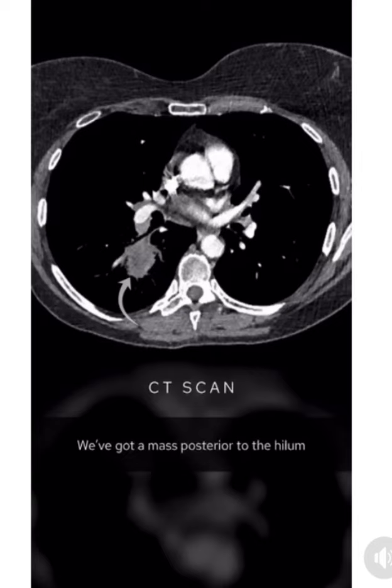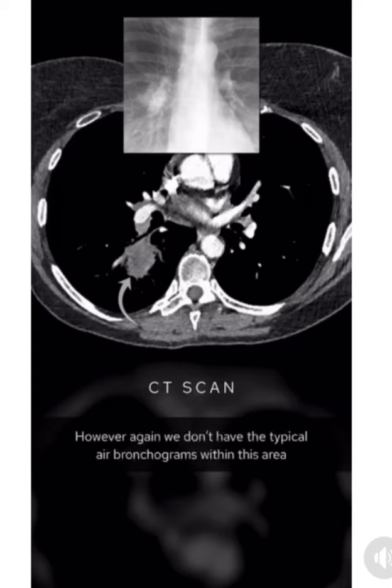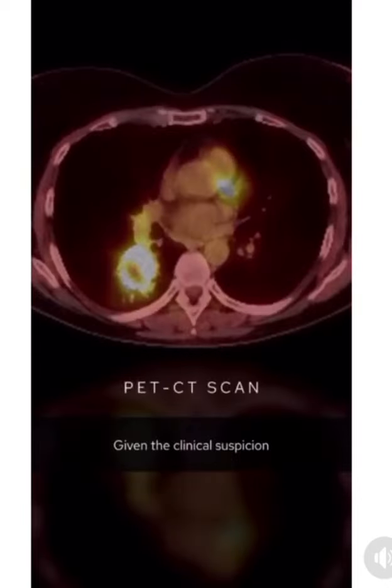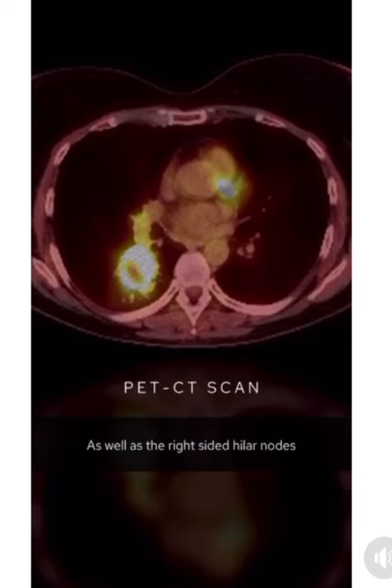We've got a mass posterior to the hilum as suggested on the chest x-ray. Sometimes pneumonia can appear like this, however again we don't have the typical air bronchograms within this area. Given the clinical suspicion, a PET CT was performed which showed FDG avidity within the right lower lobe lung lesion, as well as within the right-sided hilar nodes.